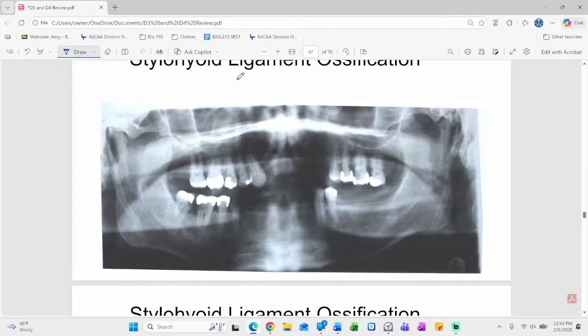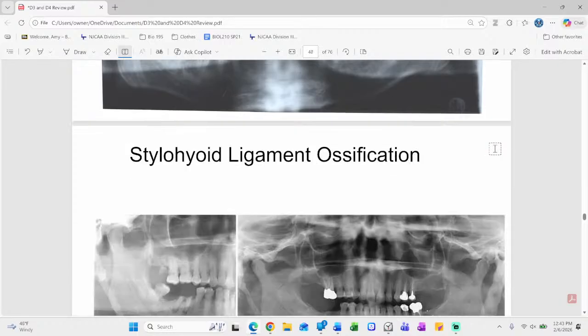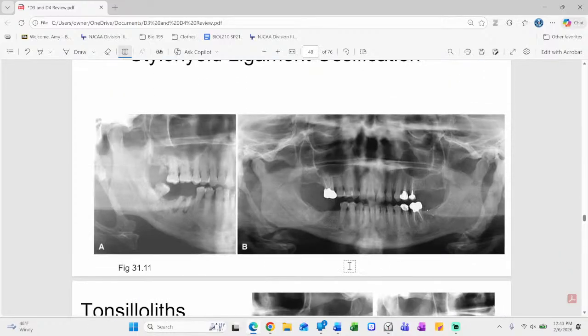Yep, those are pretty thick. And they start to look like twigs from the yard, don't they? And they even get a little segmented, kind of look like finger bones, like phalanx, right? But they can be, and yesterday, my group yesterday, it looked like a piece of bacon. It was so big. It was huge. Oh my gosh, huge. I have one from the book. But there's your stylohyoid ossification, right? So the ligament ossifies. Why those little bone cells want to grow on there, I do not know.